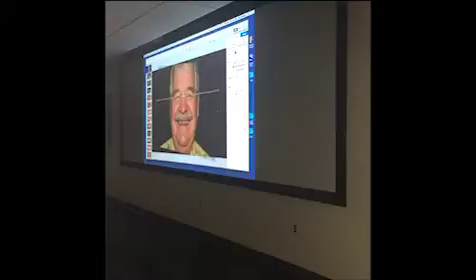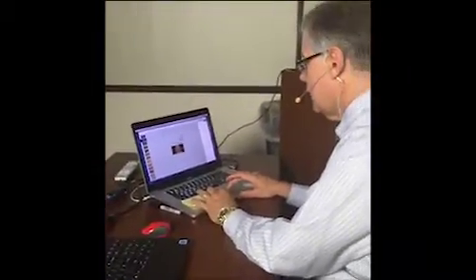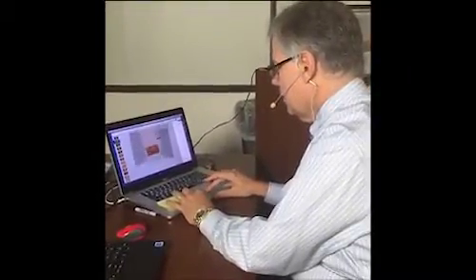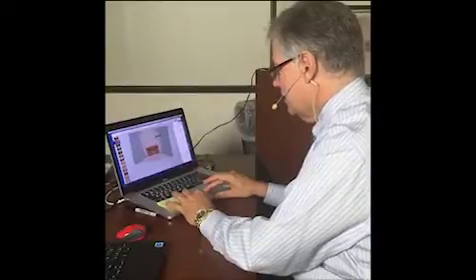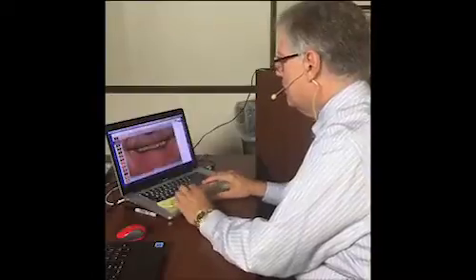So the way you deal with where the teeth are, I'm going to copy this. You see that I selected the slide up top. If I hit copy, Command C, Command V, I'll make a duplicate slide. Now what I can do with the duplicate slide is view it as much smaller. I'm going to make it a 25% view, so I can click on this picture and make it huge. Put his teeth in the middle of the slide. Now go back to fit my window.